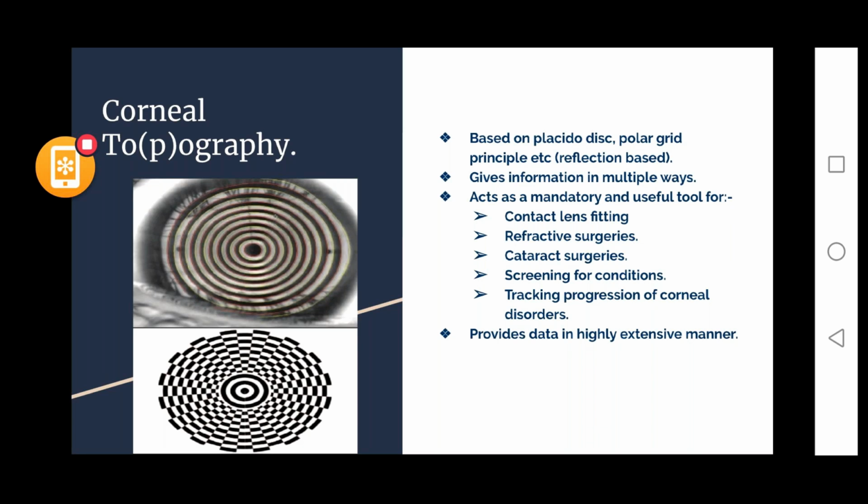So pre-operative evaluation of the cornea, whether to give a green signal for a LASIK surgery or a SMILE surgery or PRK, and so on. Then next is the cataract surgery. Now, can somebody please tell me what is the role of topography in cataract surgery?